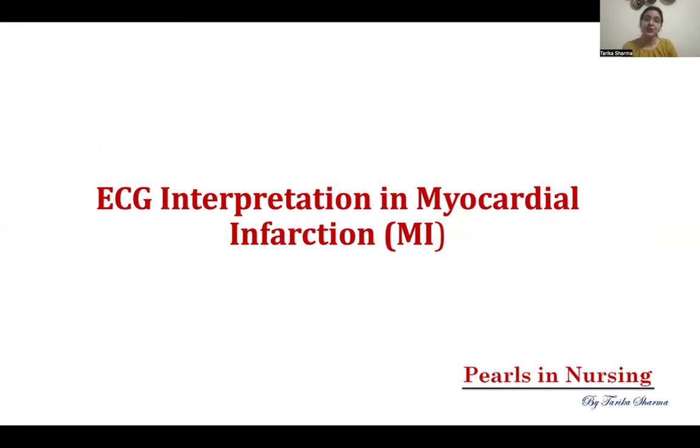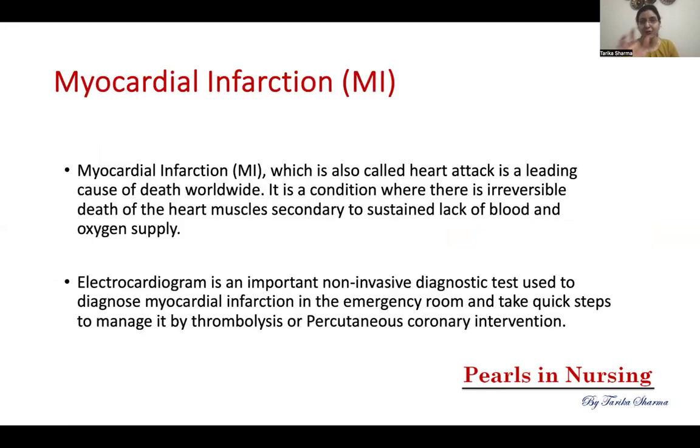Hello, everyone. Today we'll be talking about ECG interpretation in myocardial infarction. It might be a little heavy, but I'll try to make it as simple as possible for you people. So first of all, let's learn about myocardial infarction. In the previous videos also, we had talked about MI, which is also known as heart attack.